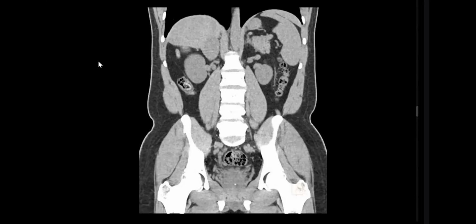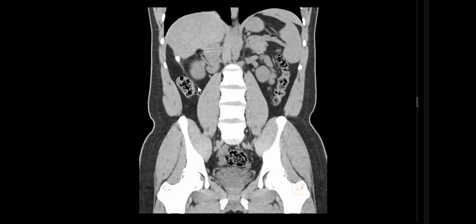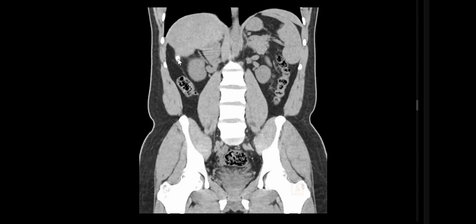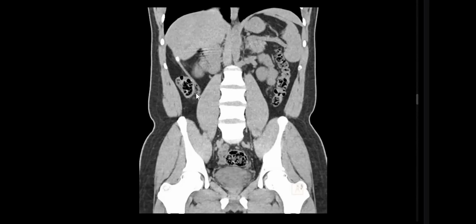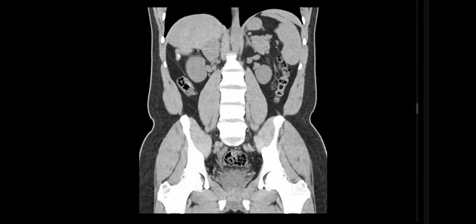But first, just to show you, my friends, you see a normal-sized appendix. And by the way, the presence of air inside the appendix is a good sign. It means a patent lumen. And the appendicolith is not at the base. If present at the base, definitely it will go into appendicitis. But this is a deceiving condition in practice. Why? Because we have a condition called tip appendicitis. Even if a few millimeters of the appendix remain, it will be inflamed.